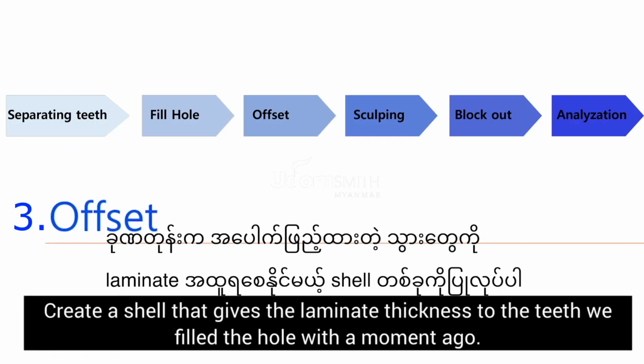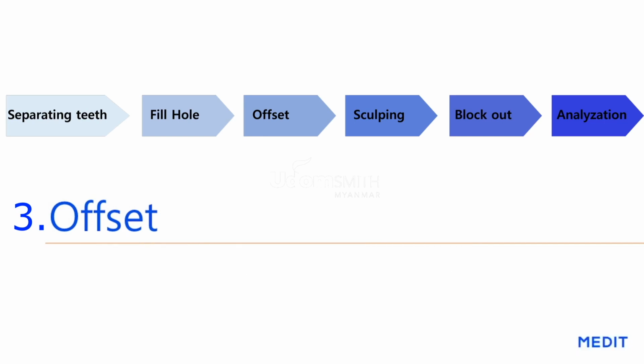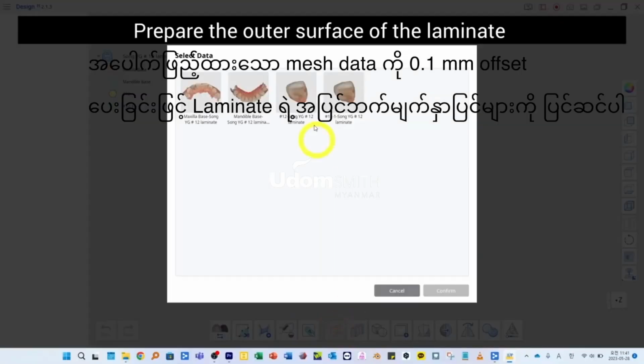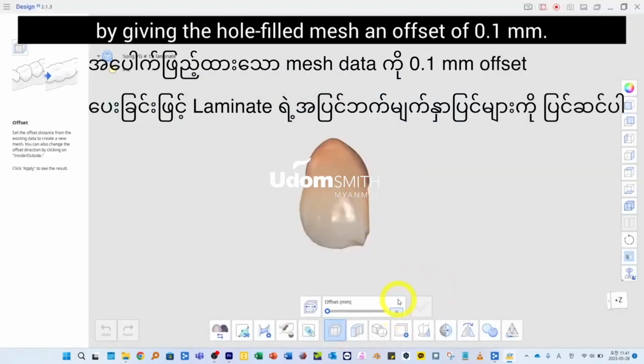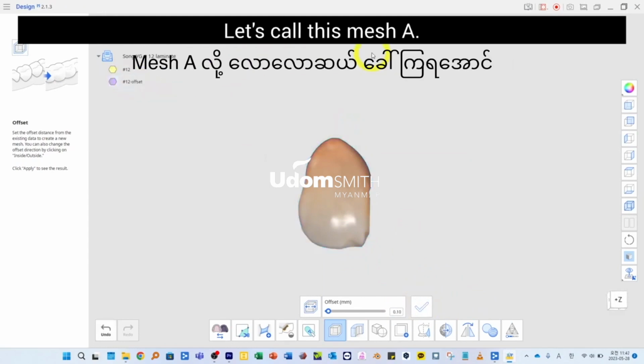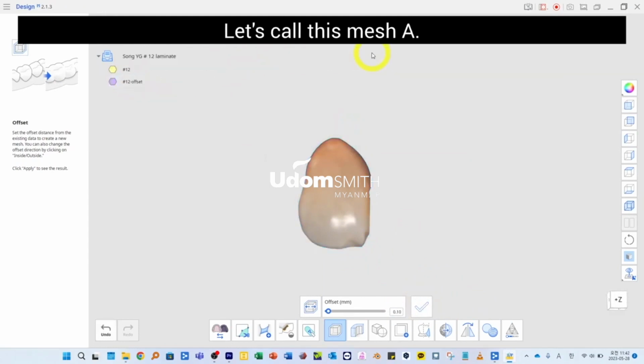Create a shell that gives the laminate thickness to the teeth we filled the hole with a moment ago. Prepare the outer surface of the laminate by giving the hole-filled mesh an offset of 0.1 mm. Let's call this mesh A.